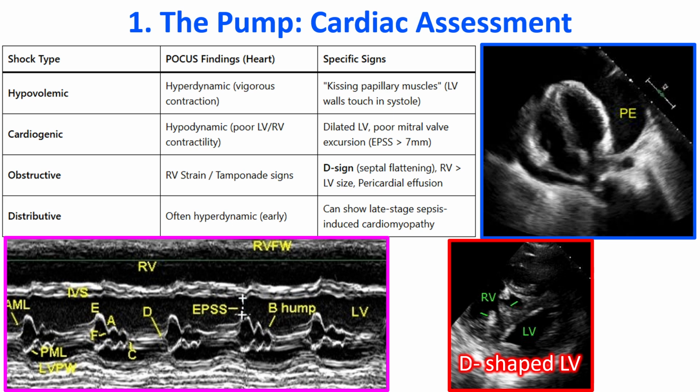The M-mode echocardiogram at the bottom shows EPSS, or E-point septal separation, of the mitral valve echo. E-point is the maximum opening motion of the anterior mitral leaflet. Normally, it will reach almost up to the septum with only minimal separation. Increased EPSS means mitral valve opening excursions are low due to low cardiac output state. This M-mode echo also shows poor left ventricular contraction as evidenced by little movement of the interventricular septum towards the left ventricular posterior wall.